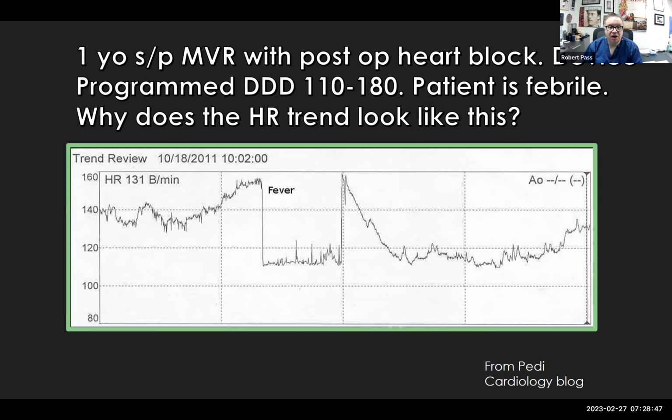Every once in a while, when patients are being evaluated, you not uncommonly see a tracing like this on a treadmill test or on a bike ergometer test for a stress test. At least twice a year, I get a call from the stress lab that somebody having a stress test, usually a Fontan patient having a surveillance stress test, will do something like this as their sinus rate rises. I'll be asked to reprogram the pacemaker to track higher rates better, like atrial sinus tachycardia. So yeah, that's what that is.